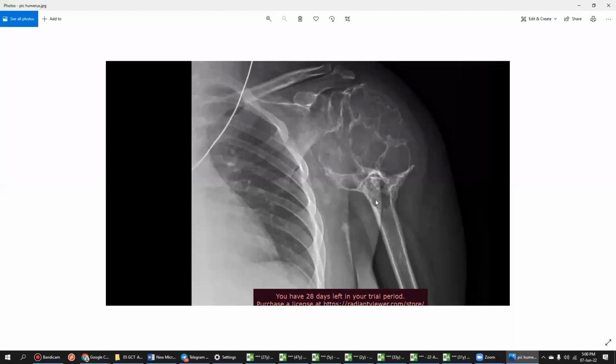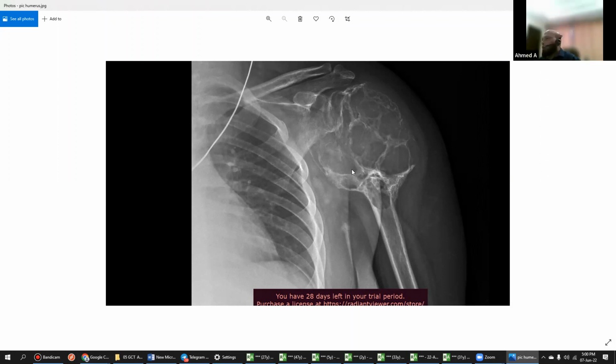Zone of transition, definitely. No, this is narrow, right? You can see here. But this one we cannot say, because there is no zone, right? There's no parenchyma here. I agree, this is a sharp zone, but this whole mass, we don't see where it is starting, where it is ending, isn't it? Okay, fine. If you're asking me, it is involving the subarticular region and everything. But if you're asking here for transition, okay, we can.